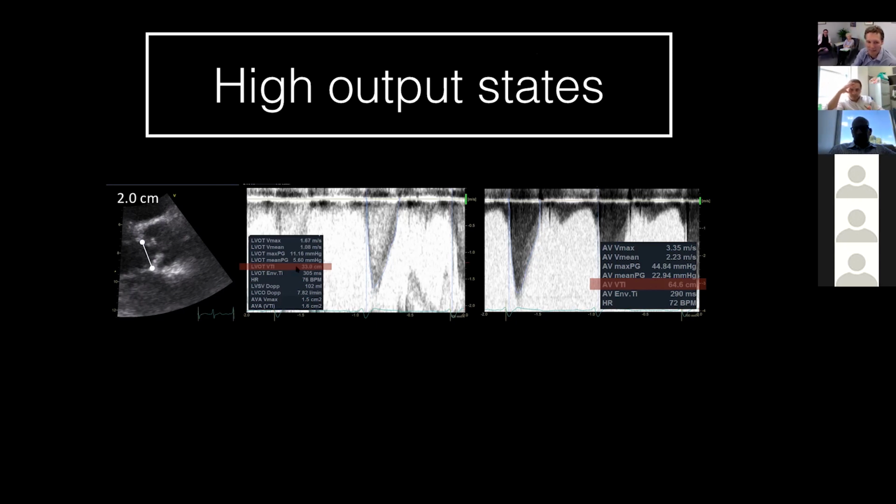What's the key of this? The key is that the LVOT VTI is really high, right? Yes. So we've got an LVOT Vmax of 1.7 meters per second. Can you tell me what the Bernoulli equation is? Yeah, so you need to use V1 and V2. Yeah, very nice. Does everyone hear that? It's either over 1.2 or 1.5. I can't remember what the guidelines say. I think it says 1.5. I think it says 1.2. Yeah, so I have the same thing.